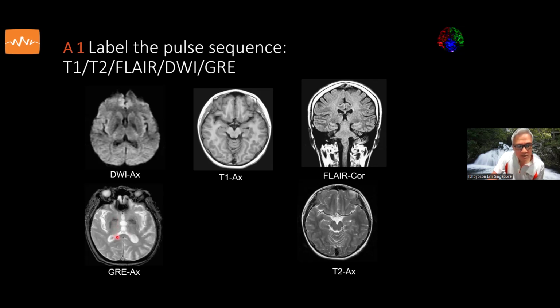Because those do not have any mobile protons, their voxels will have a signal void that has susceptibility effects affecting the voxels that are surrounding it. So in other words, the extent of the low signal intensity is a lot more hypo-intense than the actual voxels themselves.